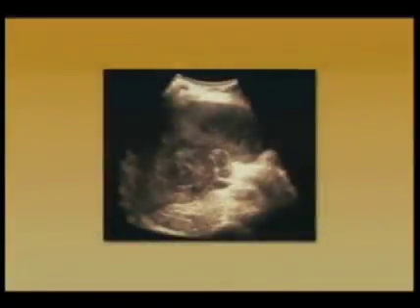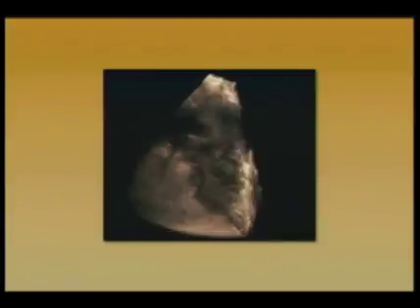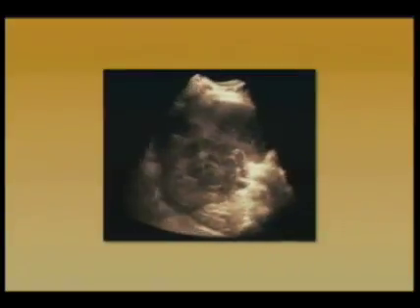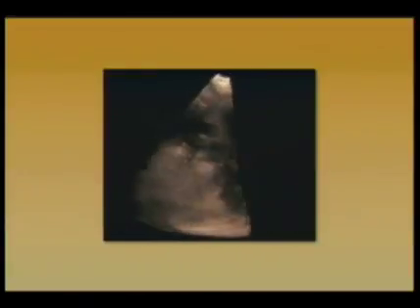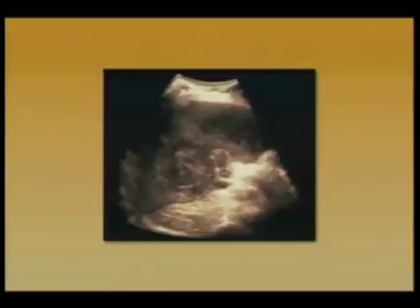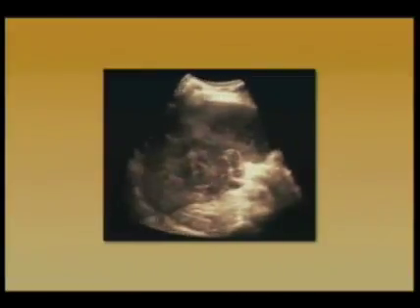Another fairly early case from a couple years ago showing an abscess in the right hepatic lobe, and this is located near the porta hepatis. You can see a bit of the portal vein and hepatic artery adjacent to this. This was actually very useful to illustrate to our referring clinicians where this abscess was located.